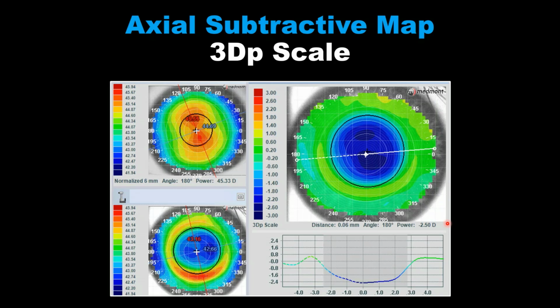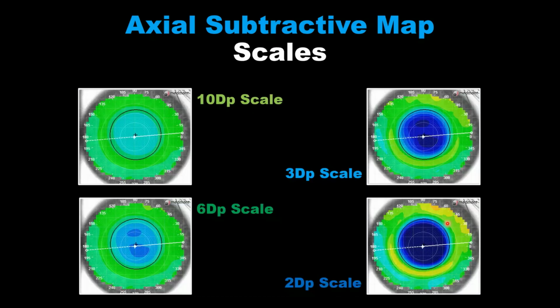And for more information on orthokeratology analysis with your Medmont, talk to your Medmont distributor, go to the Medmont website. There are numerous videos related to pre-ortho-K analysis as well as post-ortho-K analysis.